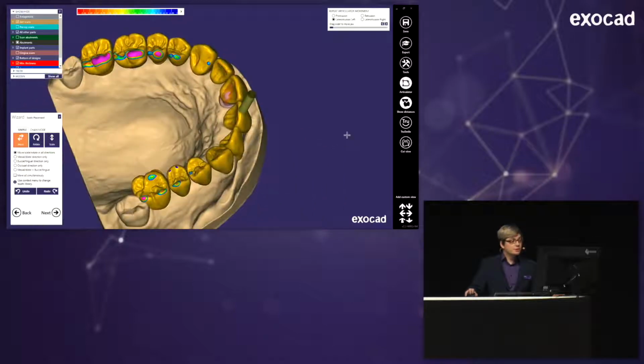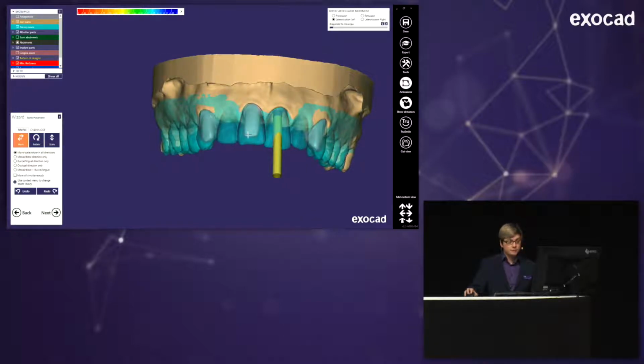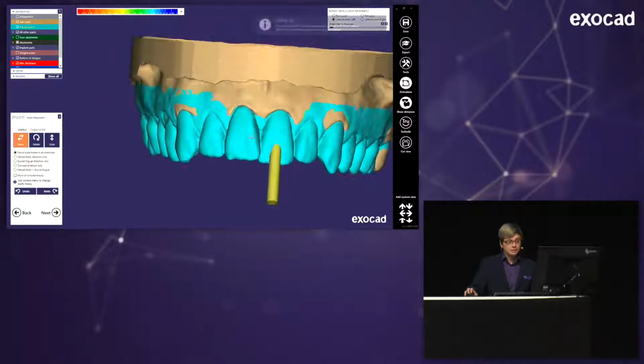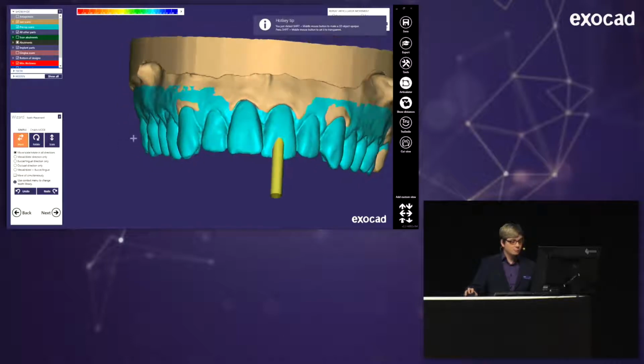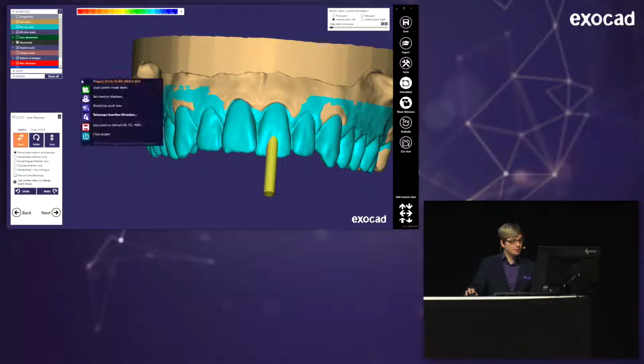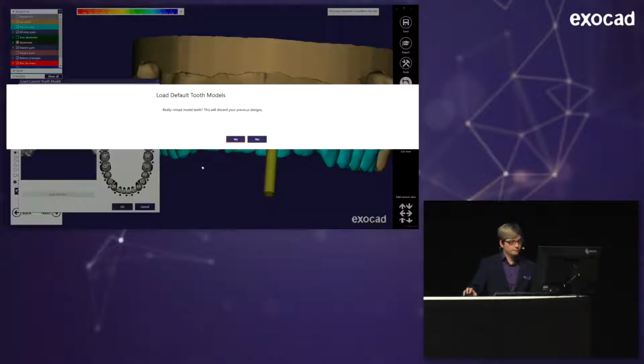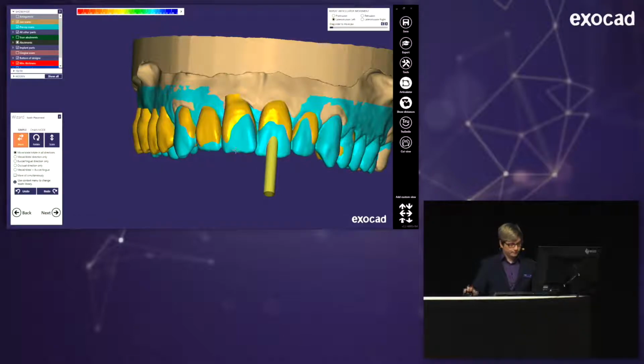And I'm actually going to use the pre-op model for orientation of which tooth library I will take for this case. Because you see, those are really triangular teeth with really prominent canines. And I'm loading a custom model tooth by just clicking anywhere on the screen. And I get the option to choose a whole other library. And I'm taking, for this case, the alternative library, because as you can see, it has really edgy canines. They are really long, and it has a very triangular form as well. So just going to activate that.